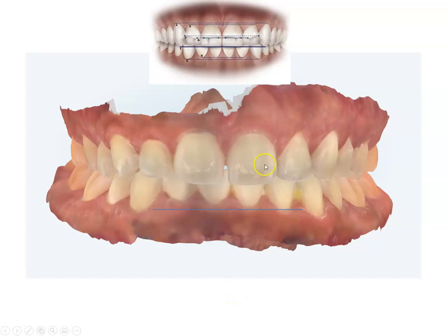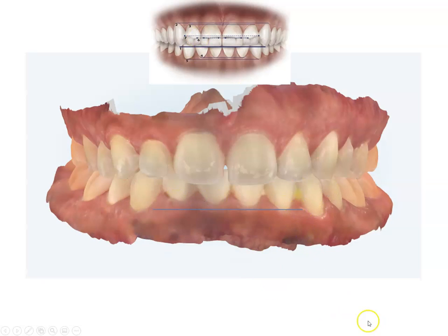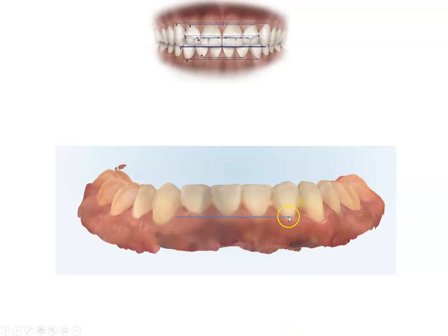The next line we look at is number 5. But before we get to 5, here's a view of how the teeth look without the upper teeth. And we can see that this line here, it's a better view, that if we bring these down a hair, we can create that ideal symmetry where all the front four teeth have to align. And if you look at the canines here, that's line number 5, the canines or the sharp teeth, they do line up. So that's pretty good.